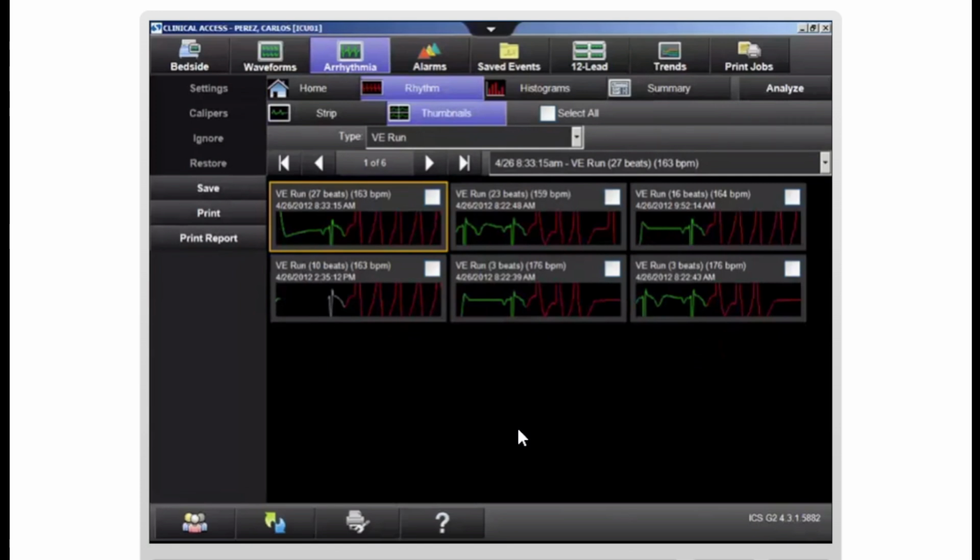The highest priority of each type of event is always in first position on the display. Identification of the length of each event will be visible along with the time and date of each occurrence. This will allow the care team to follow changes in the patient's condition over time for appropriate documentation of important condition changes and effective treatment of the patient.